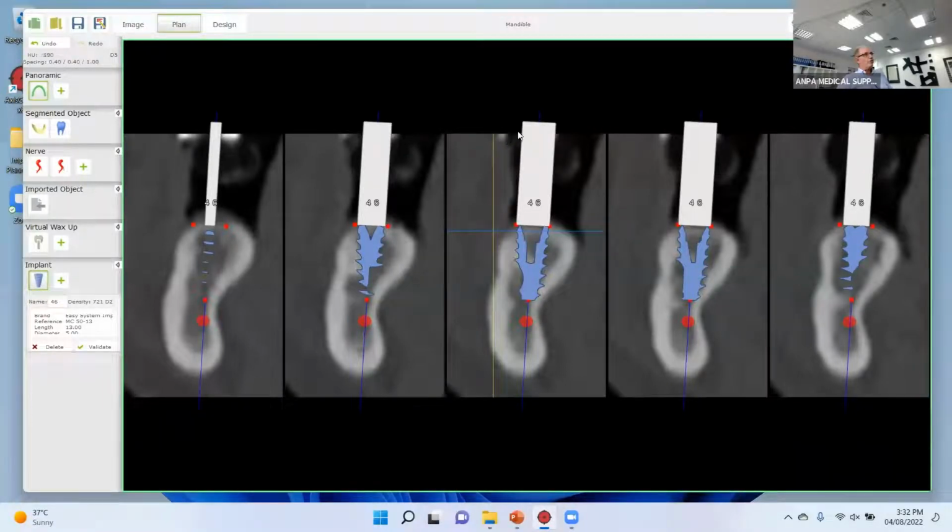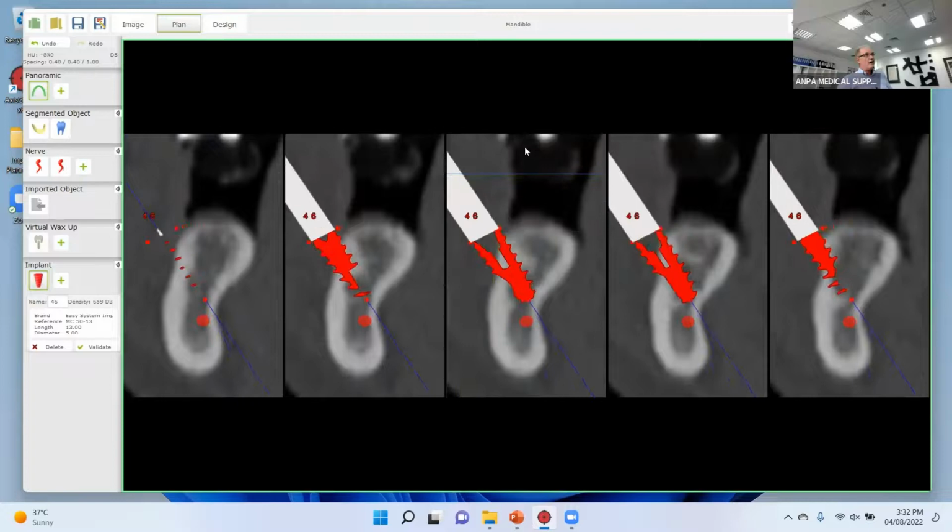One thing more, if you don't have a tooth to guide you where to emerge, look at that. Here you have a dark space. This is the couloir de château, the corridor of château. The person who named it said that this space is in the middle of the force going inside and the force pushing outside. And this is where the teeth are going to stay.